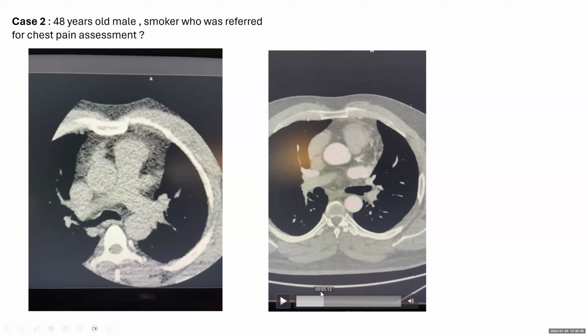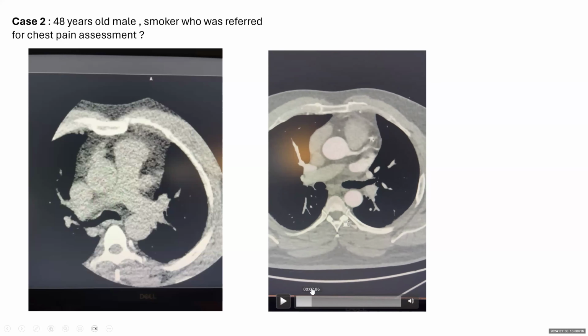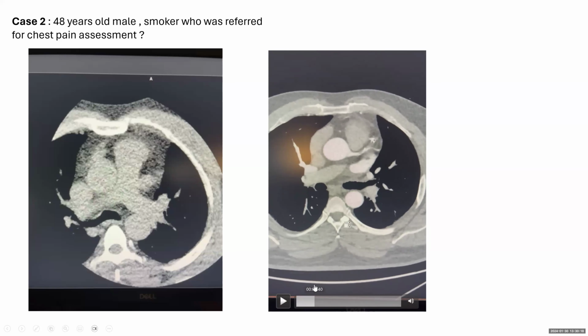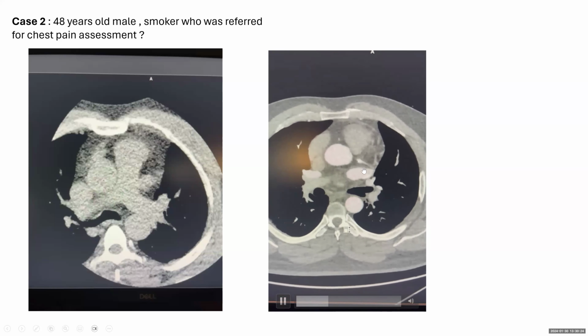And as the left main is bifurcating into the LAD and the LCX, there is a lesion in the proximal or ostial LCX, but it's not occlusive. If you look at the proximal LAD, there is no occlusive lesion. Then after the first diagonal, there are areas of haziness and probably it's occlusive.